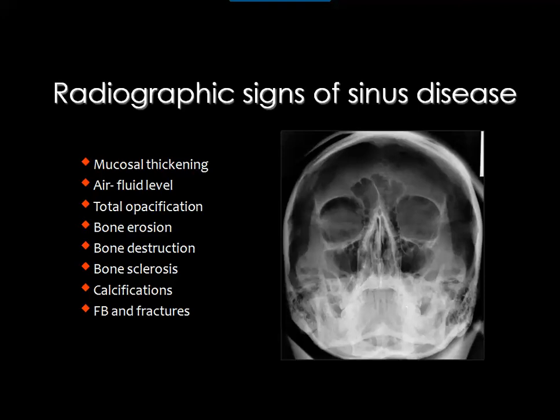Before the era of CT, we used to use this view, which is known as the sinus view, looking for possible fractures in the face. And you can look at the maxillary sinuses for opacification or air fluid levels, and you can also look for the fractures and the foreign bodies.